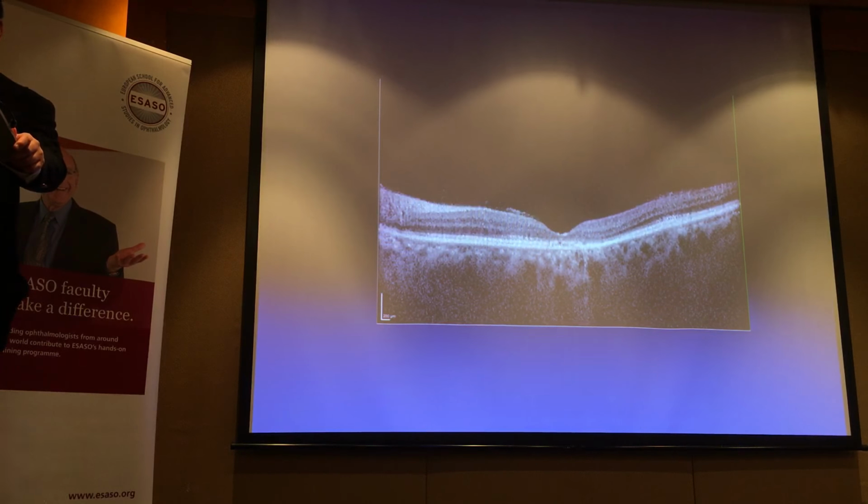Okay. Anyone notice anything about this? I grant you I'm only giving you one cut. The fovea is thin, okay? And there's a bit of disruption of the ellipsoid band there. So it's thin, good point, good pickup. When this was referred, the question was, why is this part of the retina thickened? But it happens, right?